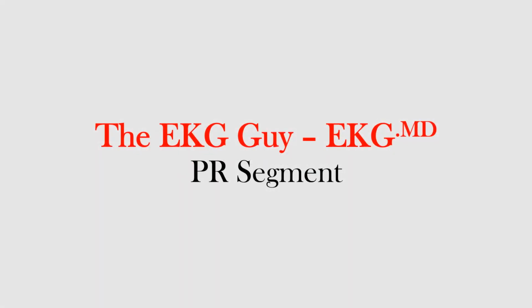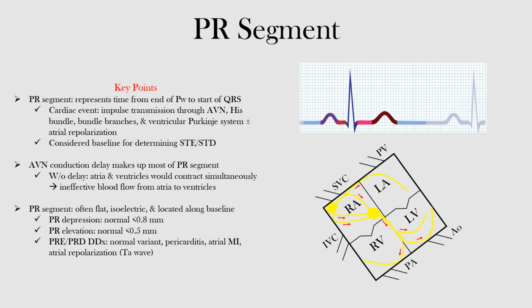In this lecture, we will discuss the PR segment, specifically what it represents and how it should normally appear on the EKG. The PR segment represents the time from the end of the P wave to the start of the QRS complex. If you look here, this is our P wave, this is our QRS complex, this is our T wave. Our PR segment is from the end of our P wave, at this point here, to the start of our QRS complex, at that point there. So this portion here is what's considered our PR segment.